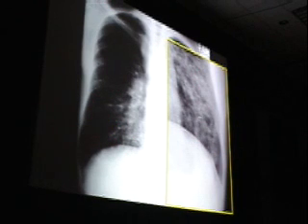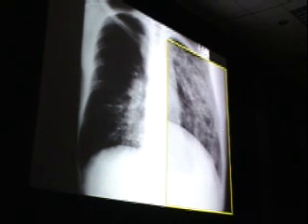I will again tell you that quite often in lymphangitic spread of tumor, you see very prominent septal lines. So this is another one with good septal lines. Lymphangitic spread of tumor is actually a bit of a misnomer. Most of these diseases are not actually spread lymphangitically, they're spread hematogenously. It can occur that if you block the lymphatics, you will get a pattern that looks like lymphangitic spread. But most commonly, pathophysiologically, it is a hematogenous dissemination of the tumor emboli to the distal parts of the lungs and antegrade growth through the lymphatics.